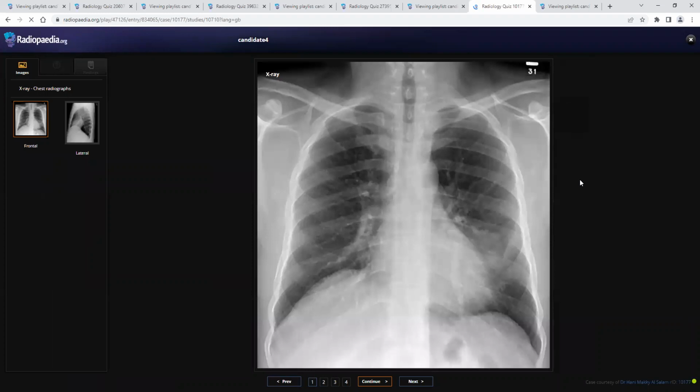Okay, I am given an X-ray, frontal view, of a skeletally immature patient. I can see there is inhomogeneous opacity in the left mid zone, and no evidence of any calcification, and there is no evidence of any obscuring of the left lateral border of the heart. The bones around the region and the abnormality appear fine. Okay.